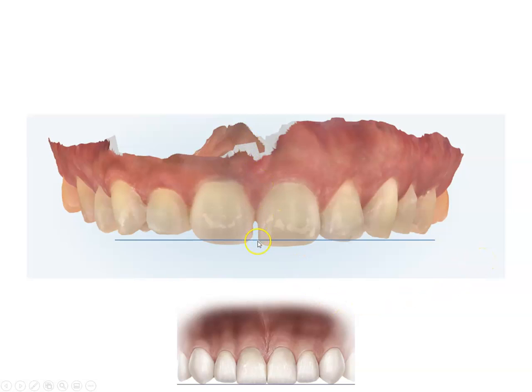And we were looking at her midline before that it looked pretty good. We now see that there's a gap. We're going to have to bring the teeth together, and we'll cover all of that when we're building her smile on the Invisalign program.